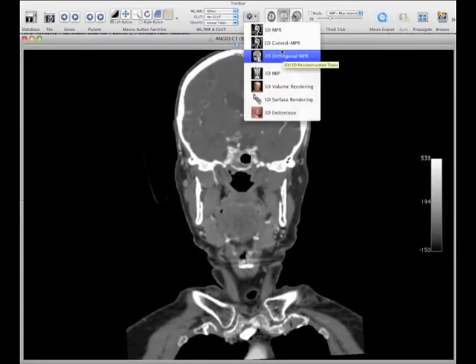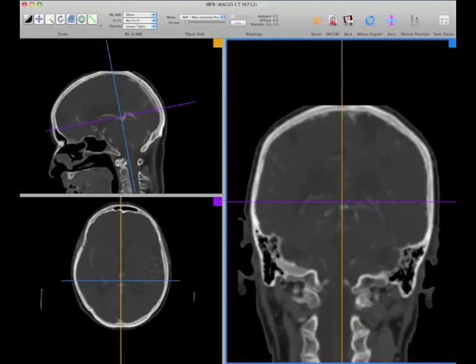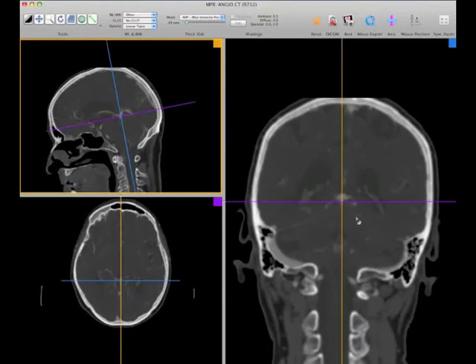And then there are some other ones which are really interesting. The 3D MPR, if you click on that, once you're in Osirix, it will bring up something like this. And it allows you to see a slice through any section at any orientation in the brain. So here, this blue slice is what is appearing in this window, right? And so if I move this forward or backward, I get a slightly different view based on where that slice is.